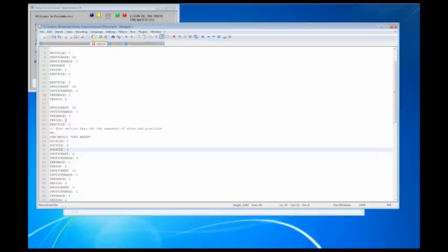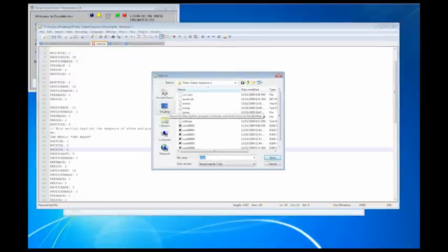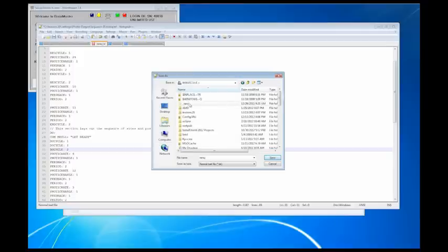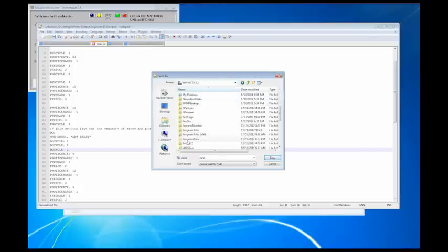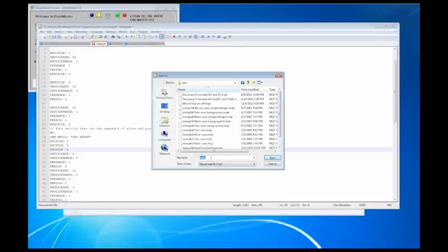So, I've done some changes. I want to say I want to use this going forward. So what you do is you click the File button, you click Save As. Once again, we are going to go to our desktop. We are going to go to our computer. We are going to go to the C drive. We're going to go to BrainM.20, Control, SW for the 3.0 software, SWD for the Discovery software, and once again, Computer, C drive, Program Data, BrainMaster, Control, SWD for the BrainAvatar software.